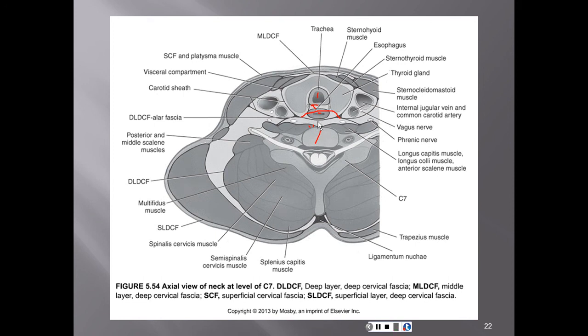is what you'll be looking at. And the larger it is, the more blood is in there, and the more blood, that means the more traumatic the injury. So if you see a lot of prevertebral soft tissue swelling on a neck trauma patient, it is a very serious condition. Keep that in mind.